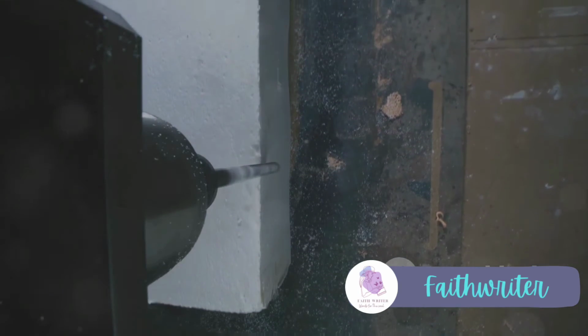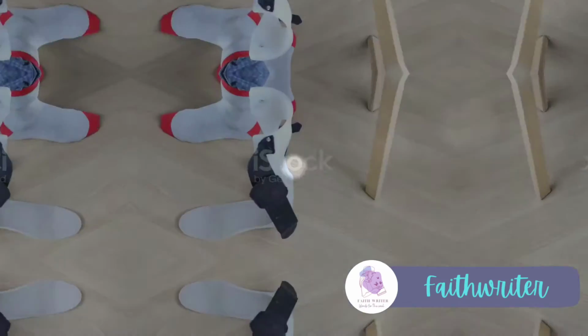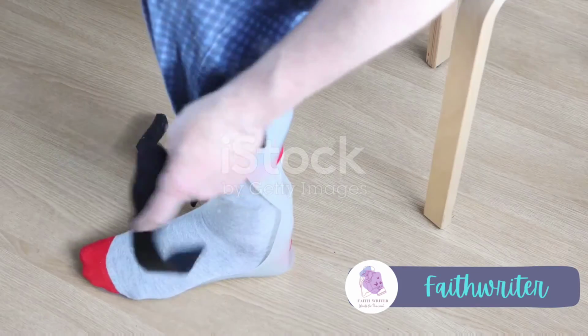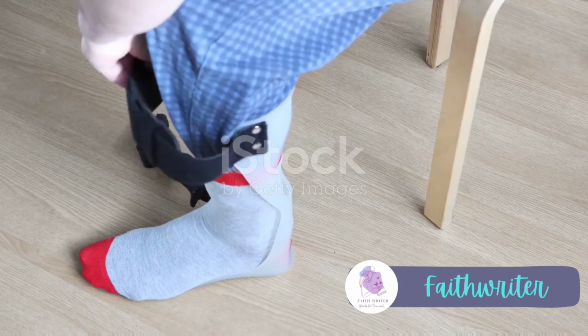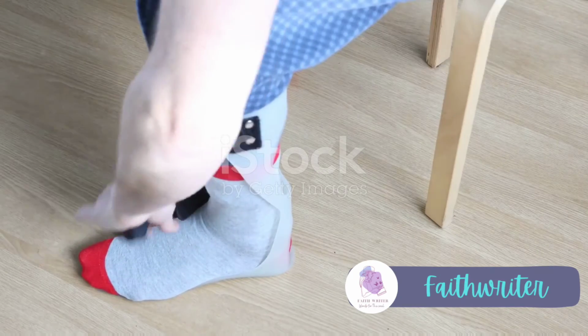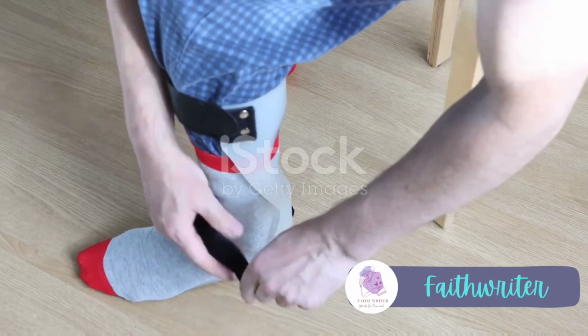The chosen materials are expertly manipulated using techniques like vacuum forming or CNC milling to cut and shape the material. An AFO typically includes components like a calf band, foot plate, and strapping to secure it to the leg. Articulated or dynamic AFOs may also incorporate hinges or joints to allow for controlled movement.